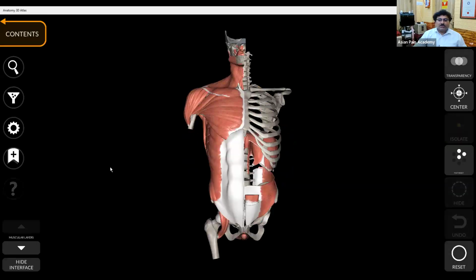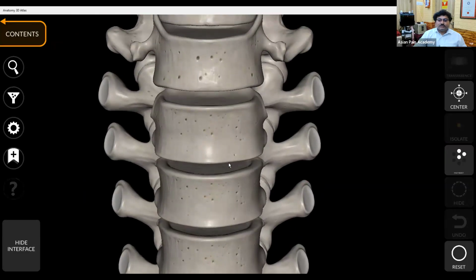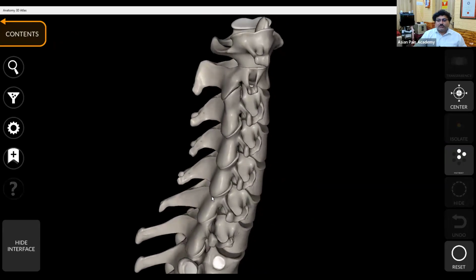Okay. As you don't have any questions, let us do one thing. Let me ask you a few questions. First, let us start with the body structures. Then we'll go to the other structures. So I'm just putting a red dot. Can any one of you tell what this structure is?